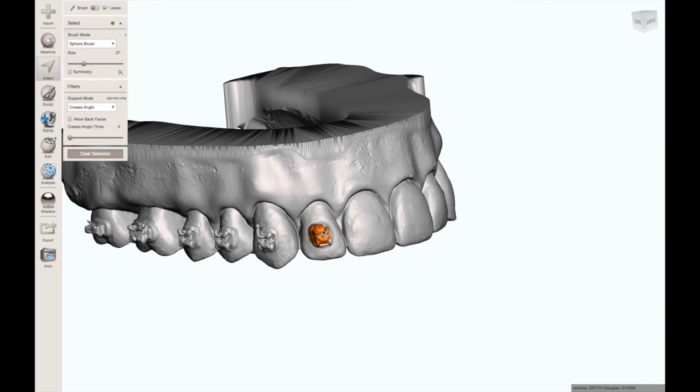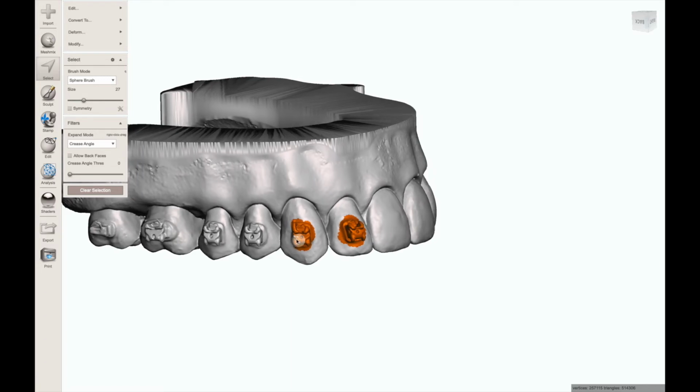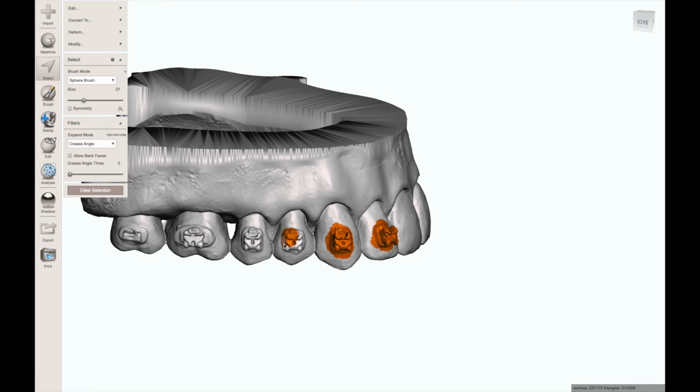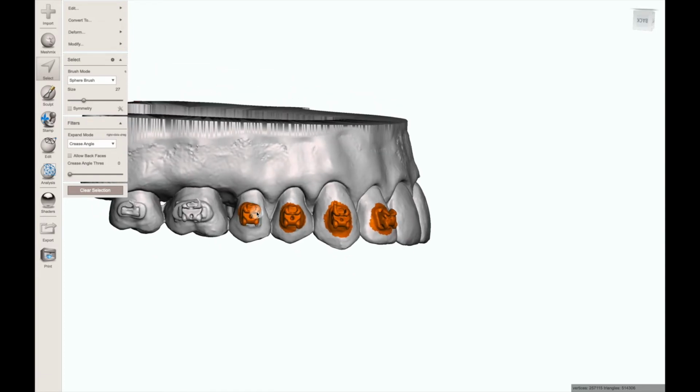Once again, just to repeat this process, because I think the best way that I learn is to keep doing a bunch and a bunch of things. There's probably easier ways to do this, but this is just the way that I do things. So circling each individual bracket, in real time, it takes under a minute for me to do the entire model.